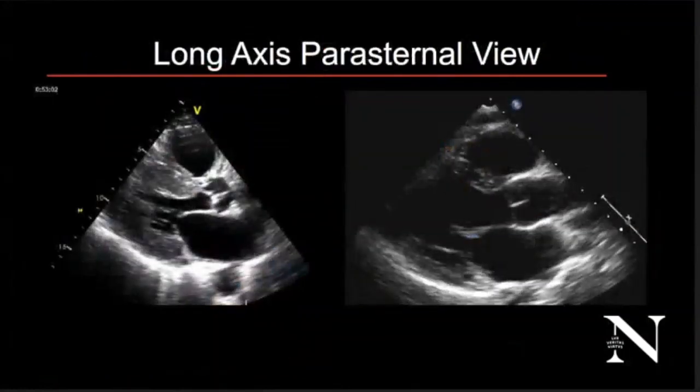So I'd like to go over a couple normal and abnormal examples, and I'd like to see if the crowd can tell me which is which. This is the long axis parasternal view. Which side has wall thickening, that's abnormal, and which side has normal wall thickness? Left, right? So left is crazy. Where does the blood go? Not a lot of room for it because the septal wall is probably 2 centimeters, as is the posterior wall. So yes, this is very abnormal. This is normal.